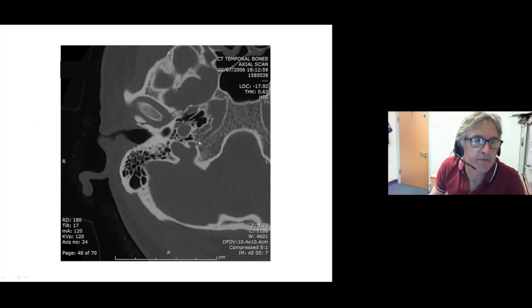This is our jugular foramen, and it's composed of two parts. There's a pars vascularis just here, a little bony spur, and then the pars nervosa. Within the pars vascularis, we have the internal jugular vein and the 10th and 11th cranial nerves. And in this little bit here, it just contains the 9th cranial nerve, but also contains Jacobson's nerve and the inferior petrosal sinus as well.